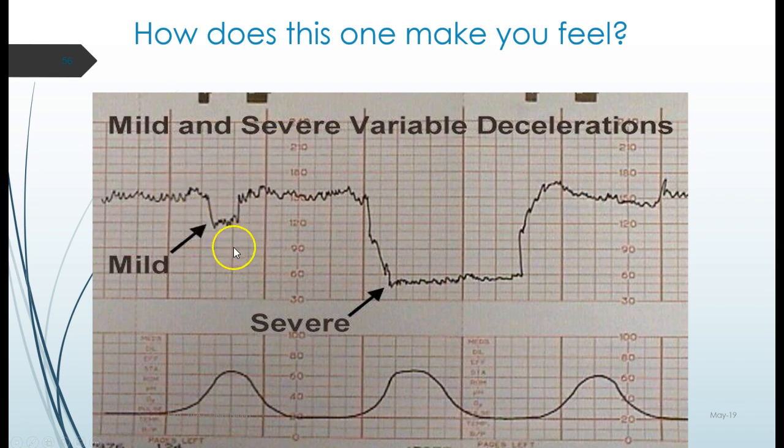This is a variable. Variability, it's a baseline characteristic. Variability, variable. Variable is an episode as opposed to an ongoing thing. I'm hoping this is making sense. The hard part about online education is you can't tell how your audience is understanding what you're saying.